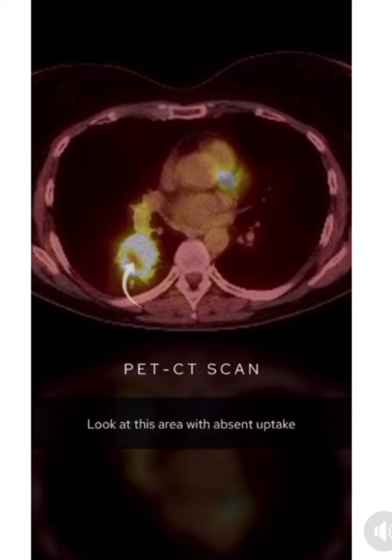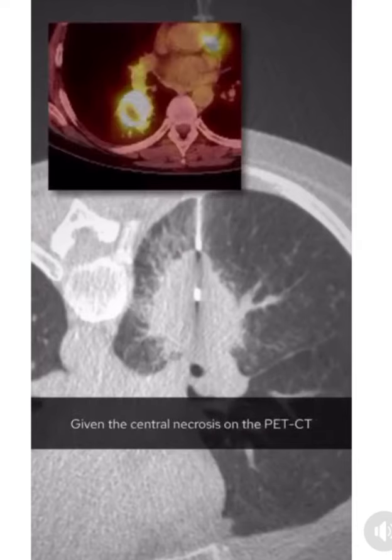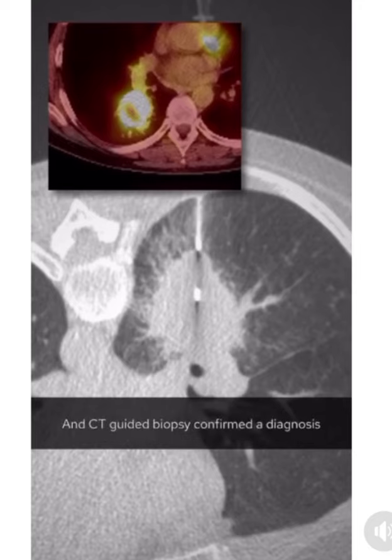Look at this area with absent uptake. This likely represents central necrosis within the tumour. To confirm the diagnosis, a biopsy is needed. Given the central necrosis on the PET CT, it's important to try and sample the periphery of the lesion in this case, and CT-guided biopsy confirmed the diagnosis of right-sided lung adenocarcinoma.